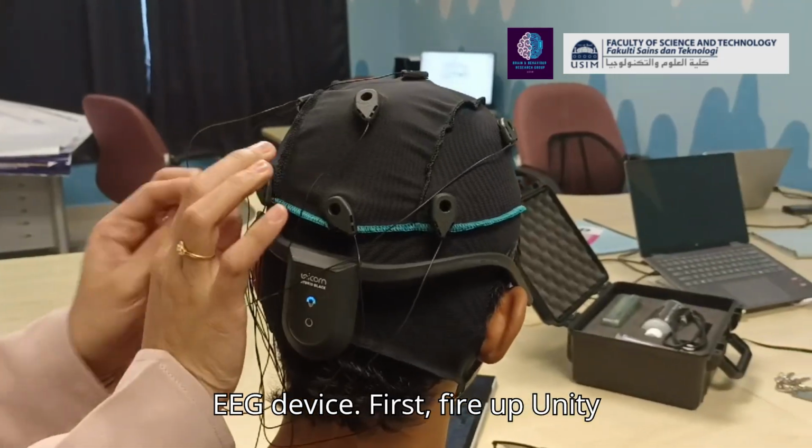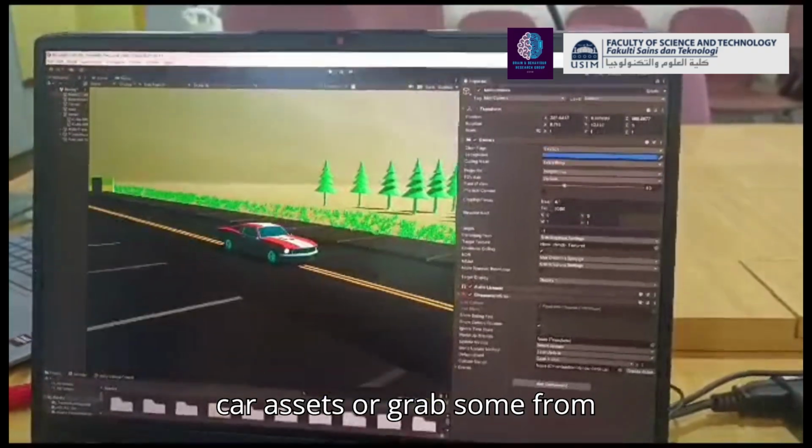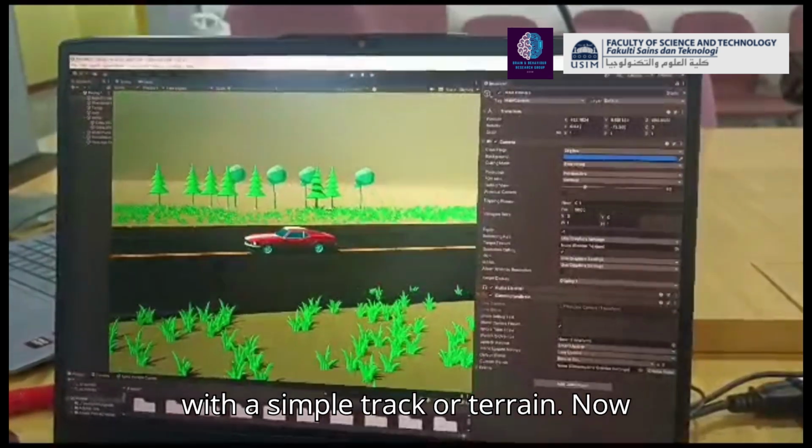First, fire up Unity and create a new 3D project. Import your car assets or grab some from the asset store. Next, set up your scene with a simple track or terrain.